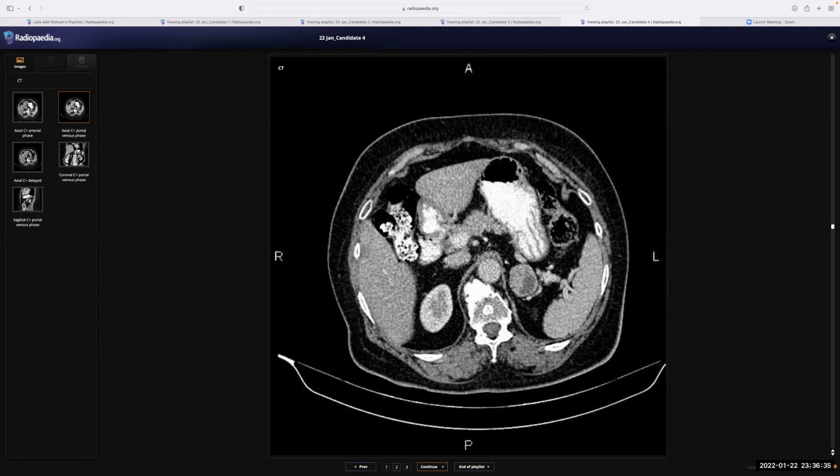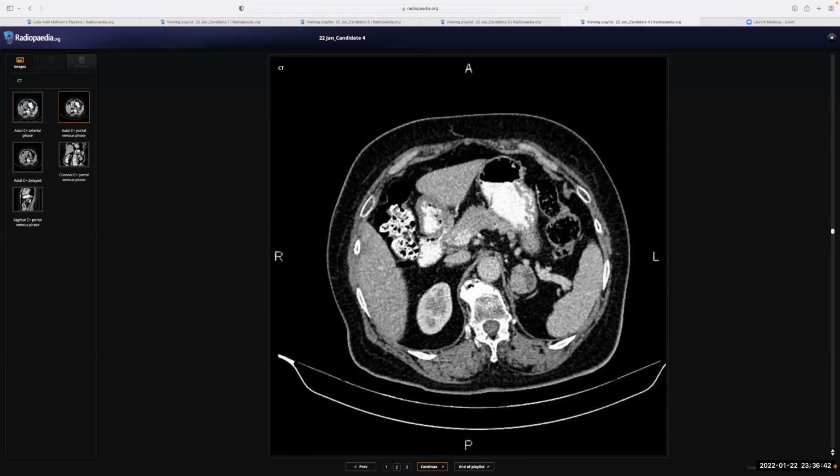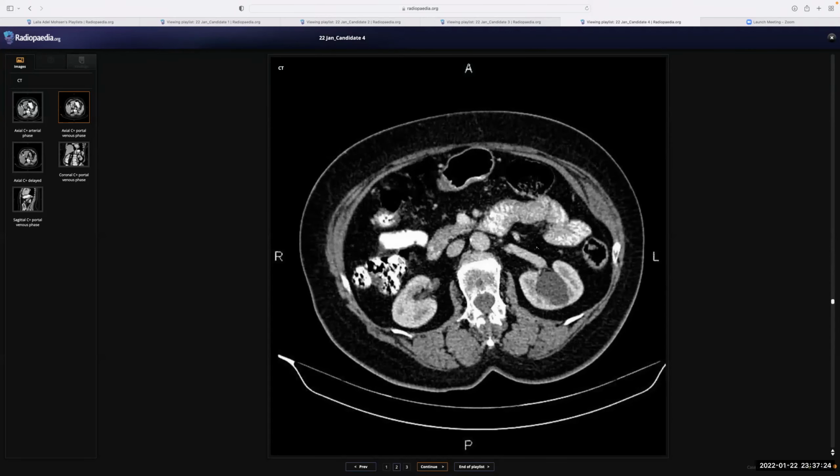I think this is a right adrenal lesion, left adrenal lesion, and this is a well-defined adrenal lesion, which is showing a low density in it. So I would like to take the Hounsfield of this lesion. If it comes out to be in negative Hounsfield unit, this could be because of myelolipoma, and I would like to see for any previous CT scan available of the same patient to compare this lesion from the previous scan about its growth. And can you scroll the images a little bit?